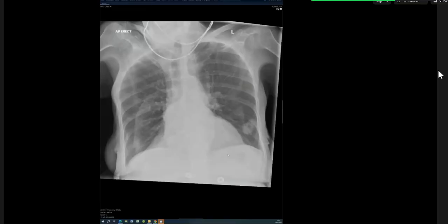So this first one, you saw that straight away. You saw there was something in it straight away. You got distracted by this. This is exactly why I put that on. It happens every single time. And the elephant in the room you missed. So it was, but I had to nudge you to get there. So every time you get a nudge, you lose marks. But as long as you get there in the end, it's still a pass.